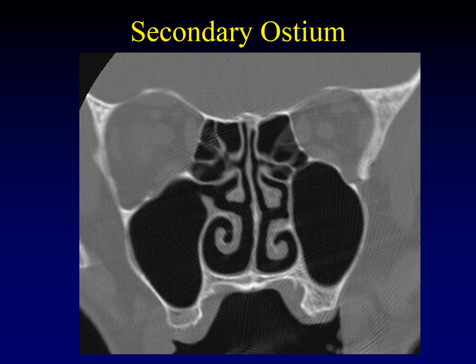Secondary ostia. Sometimes there is an extra hole, particularly in the medial walls of the maxillary sinuses. This is not the osteomeatal complex. This is in a different location. It's just an extra hole. You'd think this would be really useful, and if you blocked your osteomeatal complex, you'd just roll over to your secondary ostium, and it would be a good backup. Turns out that they're less useful than you might imagine. All the cilia are still pushing the mucus towards that primary ostium, and so secondary ostia are not as helpful as you might expect. Still worthy of mention.